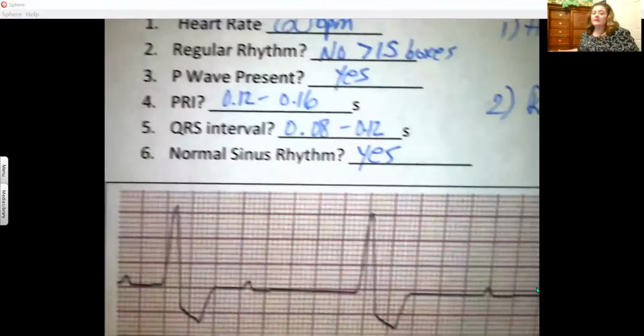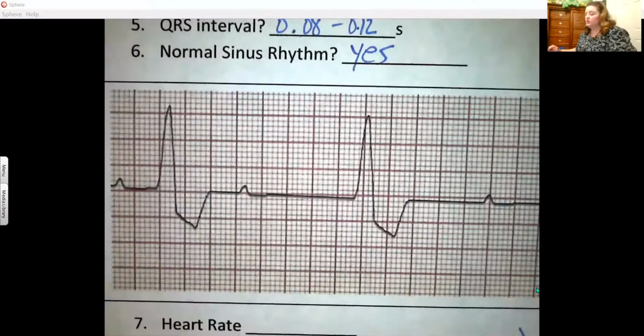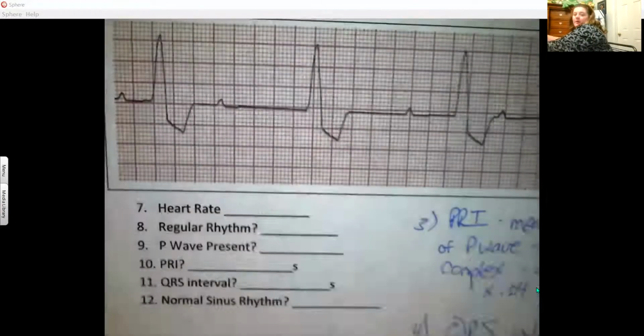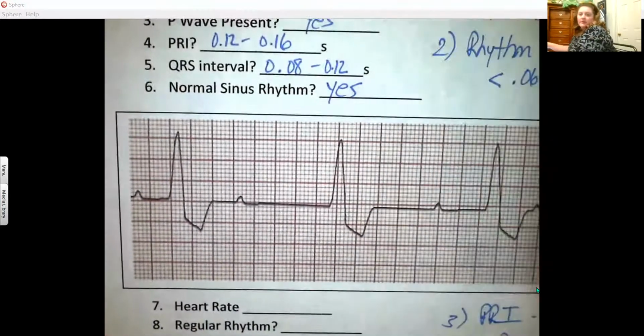Okay, take a look at the next one. Just want to show you a couple things here. And then I'm going to tell you which ones I want you to do this week.